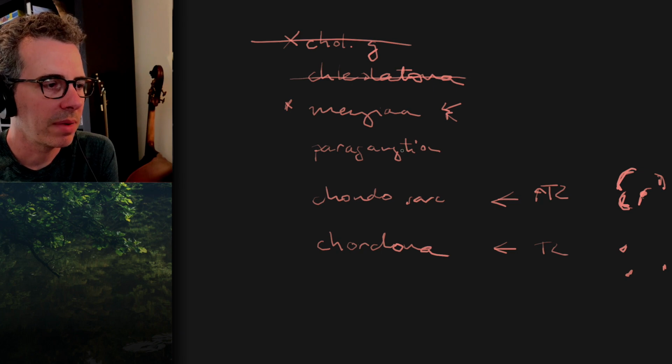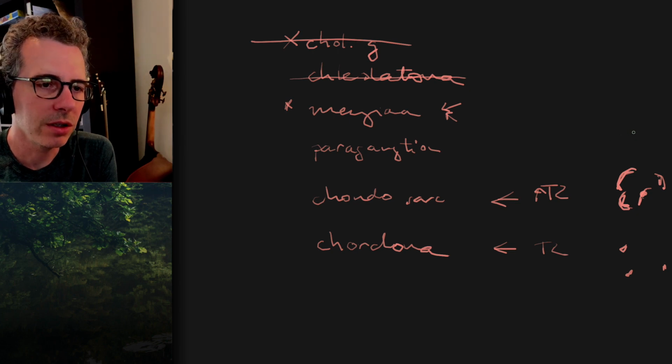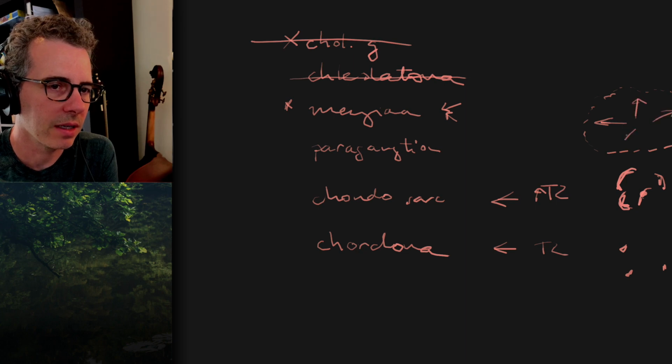Okay, paraganglioma. Well, they can look very aggressive, and they can really chew through the bone. Yep, they chew into bone rather than chordomas that come out of bone. So they're usually irregular margins of all the bone that they touch as they grow into it, and it's irregular and ugly.